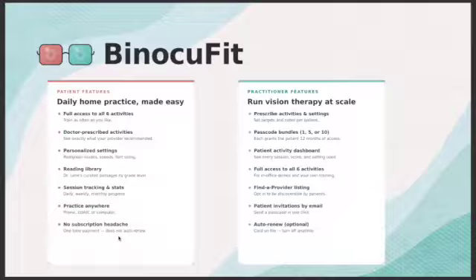And those practitioner features give you the ability to buy those passcodes, either give them to your patients bundled with your therapy program, or a la carte charge your patients for those passcodes along with the red green glasses that they need to do that, the same way that you would for any access to any of the other computer programs that have been around for a long time.